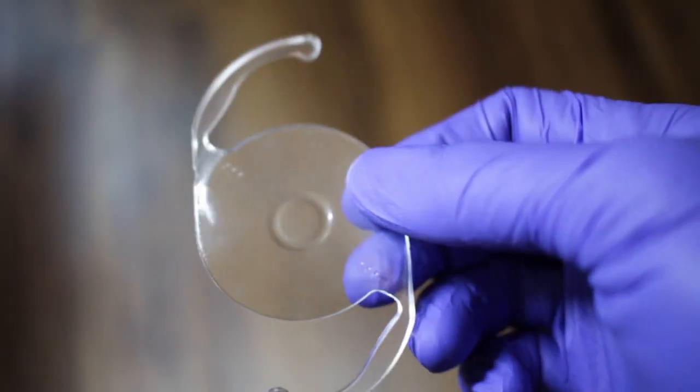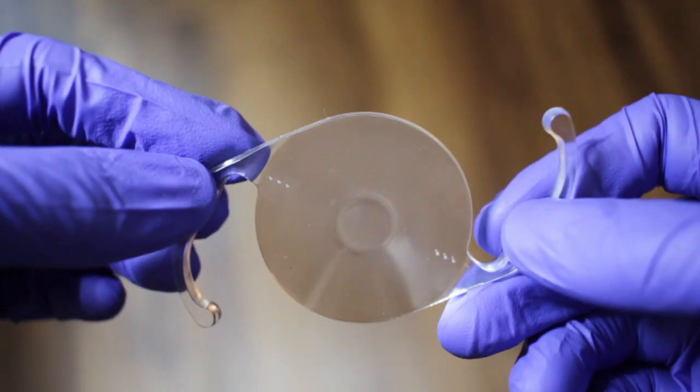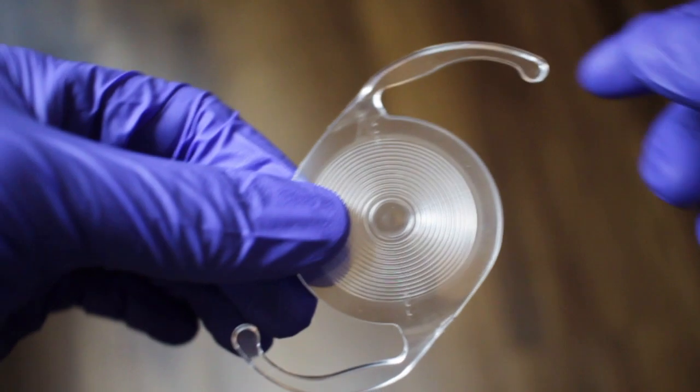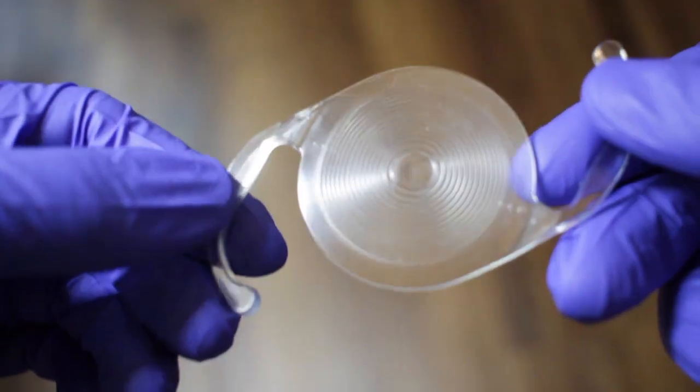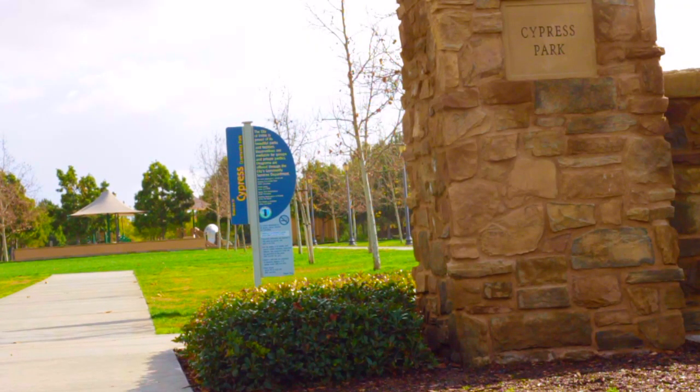Next, let's discuss the different lens options that are available to you. Mind you, if you have diabetes or any other pre-existing eye issues like macular degeneration or glaucoma, please talk to your doctor about which lens may be best suited for you. Here we will show you videos that will simulate your vision when it's normal, with cataracts, and with each of the lens options. We will show 4 lens options here. Again, these options may not all be appropriate for your eye.